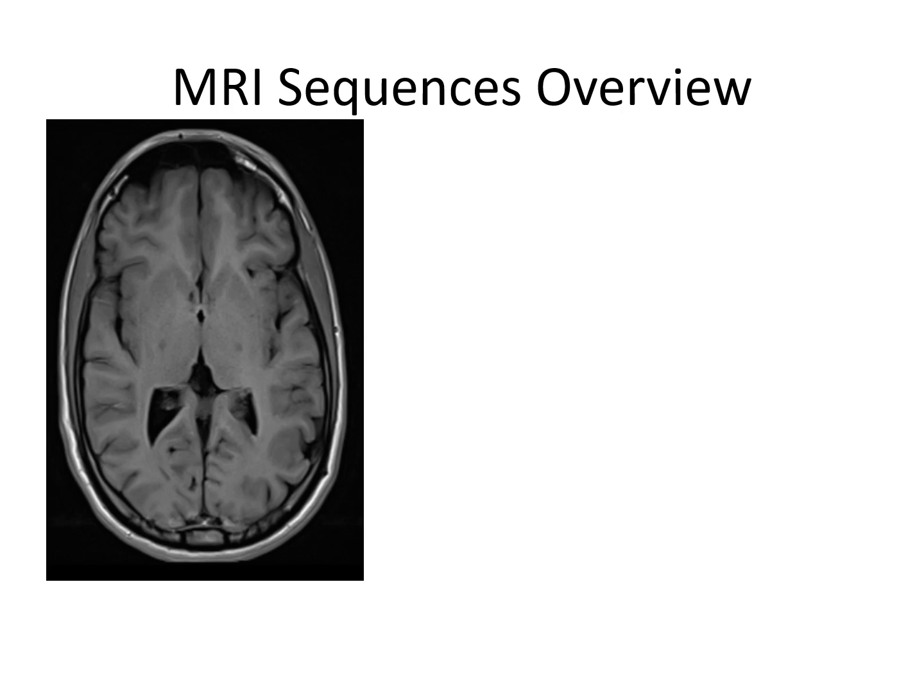In T1 weighted image, CSF is dark and white matter appears bright. As we can see here, these are the CSF appearing dark, and this bright color is the white matter. And this sequence is good for the evaluation of brain anatomy.